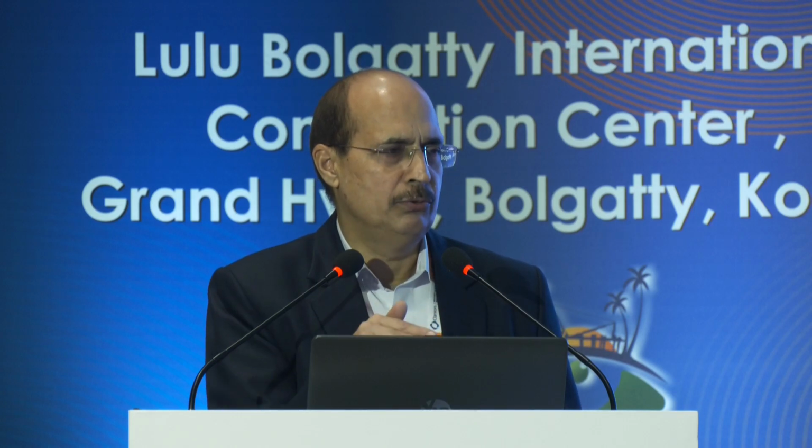Another advantage of OCTA is that in advanced glaucoma, OCT reaches a floor effect very fast, and after that the utility of the OCT becomes a little less, whereas with OCTA, the flooring effect comes much later. So even in advanced disease, when OCT is not useful, OCTA could still be used for measuring progression.